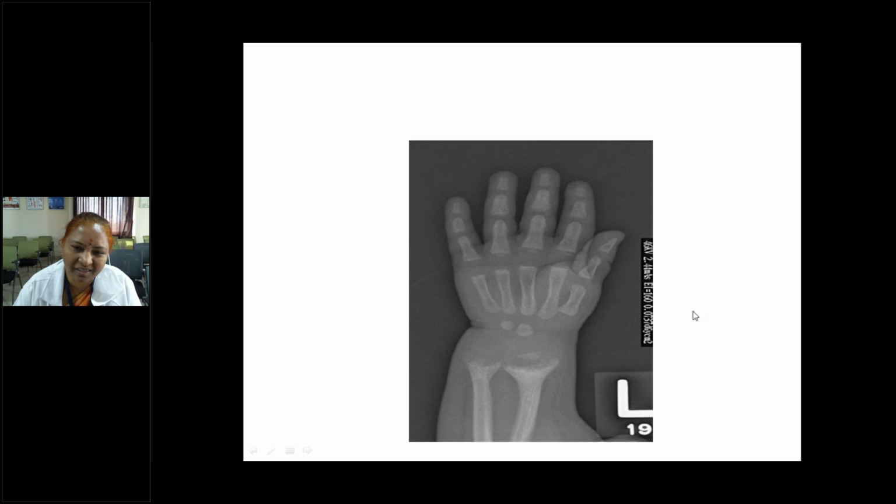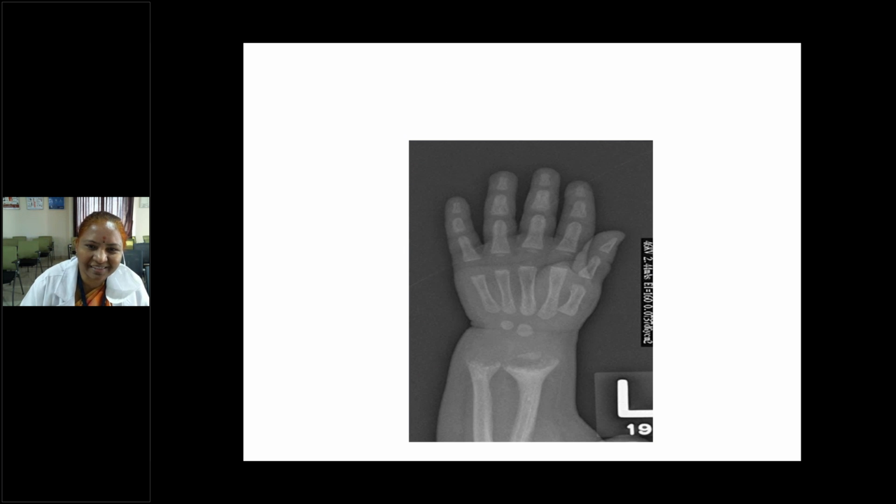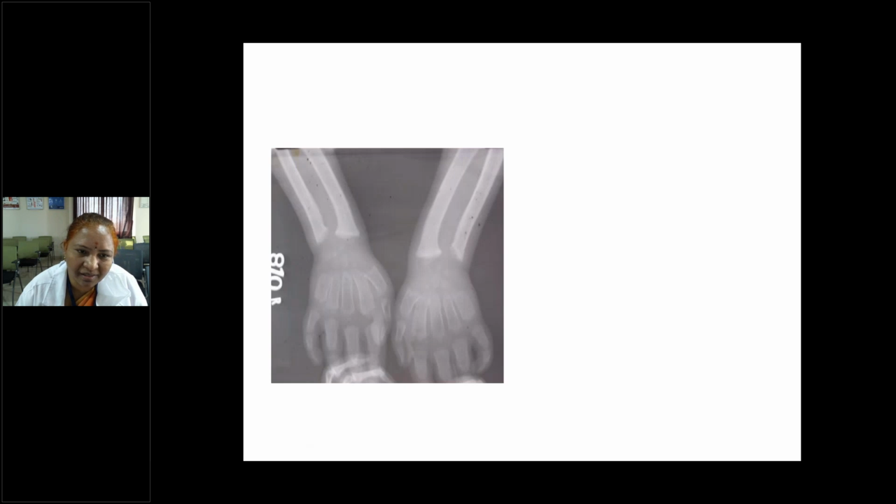This is an easy X-ray, commonly kept. Can anybody try to read? We can compare both. The previous X-ray is very dense here; these two are extremes. Here, osteopenic bones, very increased translucency of bones, with clear cupping and fraying. Cupping and fraying with osteopenic bones is seen in case of rickets. Rickets.